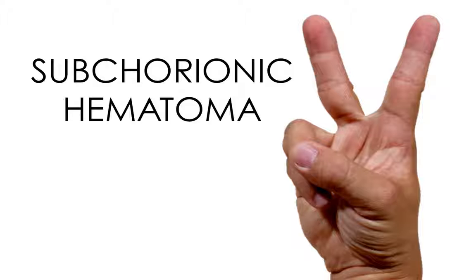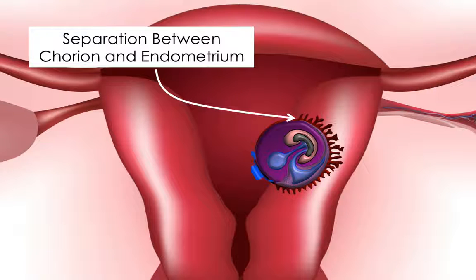The second indicator of a failed intrauterine pregnancy is a subchorionic hematoma. A subchorionic hematoma is seen when the chorion and the endometrium separate. Many pregnancies have small subchorionic hematomas that develop normally to full-term births. However, when the hematoma's surface area covers more than 50% of the chorion, it puts the pregnancy at a very high risk for abortion. When this occurs, blood collects between these two structures.